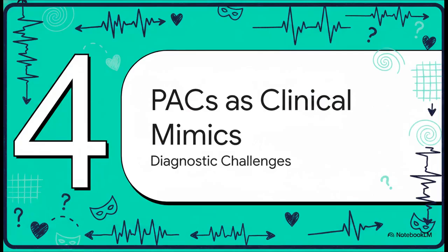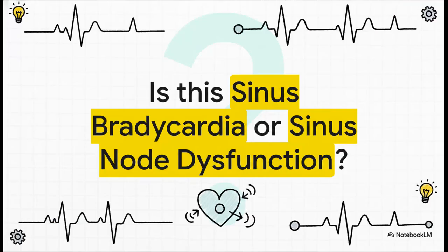And this brings us to the most clinically significant portion of this analysis. It is precisely because of these varied manifestations, and most importantly, the non-conducted beat, that APBs are famously known as the great mimics. They can create ECG patterns that perfectly replicate other, often more serious cardiac conditions, leading to profound diagnostic errors. So let's put this to the test with a diagnostic challenge.